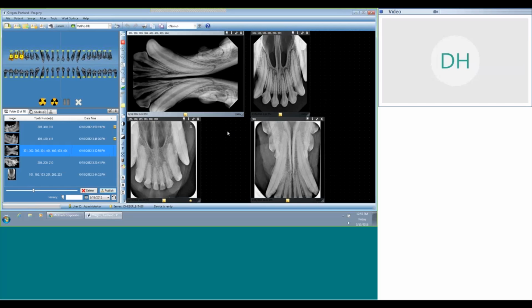You definitely want to take pictures of those things. So the neat thing about the software is that you can import those into their database here along with the digital images. I do not have any real camera pictures on this computer, but how you would make that happen is very easy. You would either acquire the images on your cell phone, or maybe you have a nice Nikon camera in the practice.